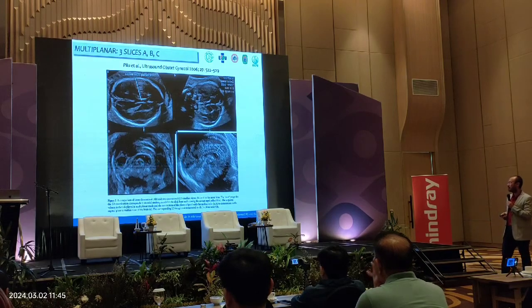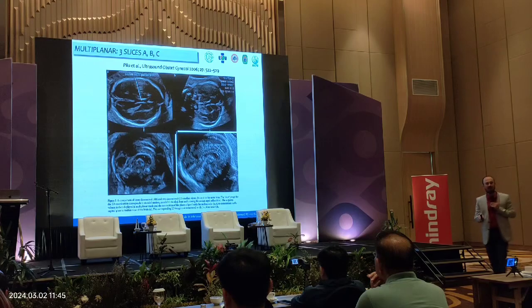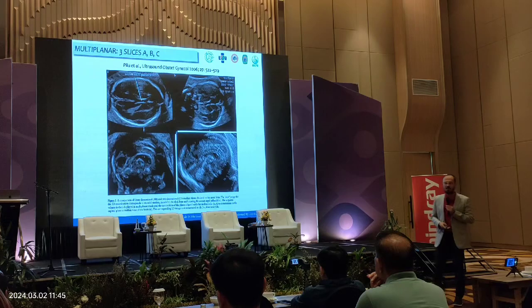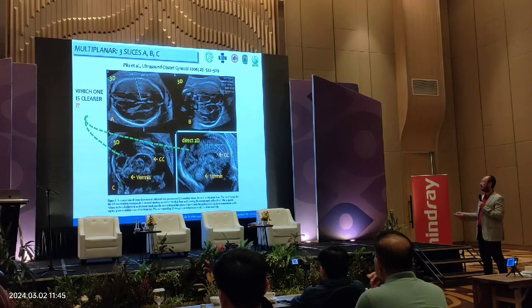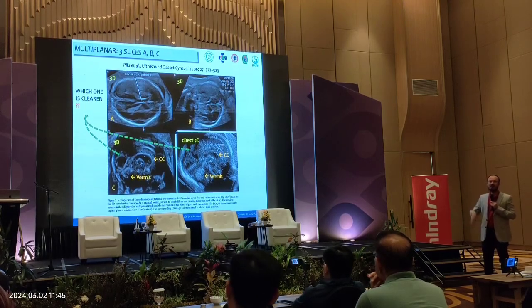So this is a study from Pilu's publications that we can see here to compare how clear we can see between transabdominal three-dimensional neurosonography and 2D direct transvaginal. How can you appreciate this? Between the direct two-dimensional, the 2D direct, we can appreciate more. It's clearer.